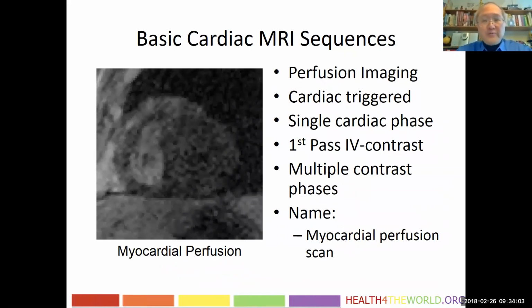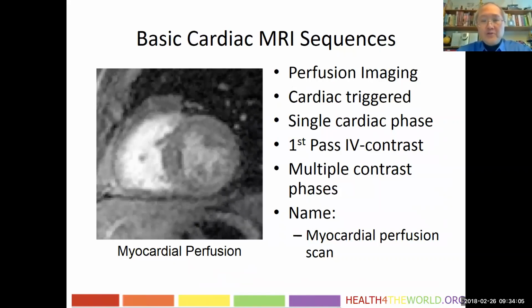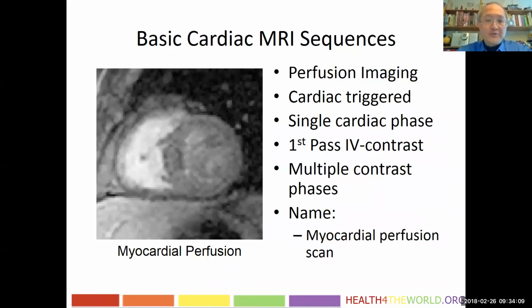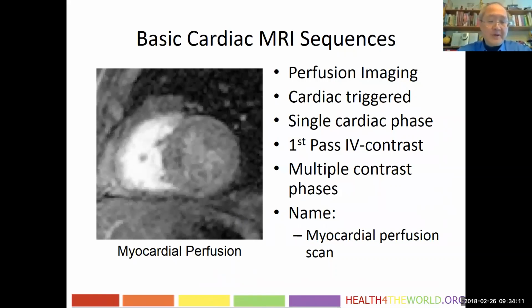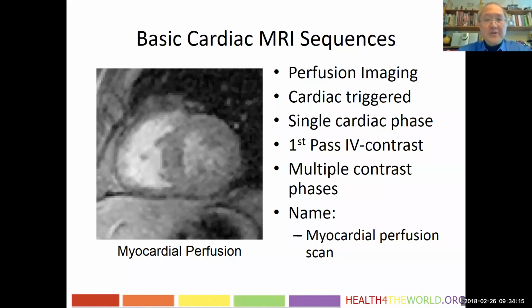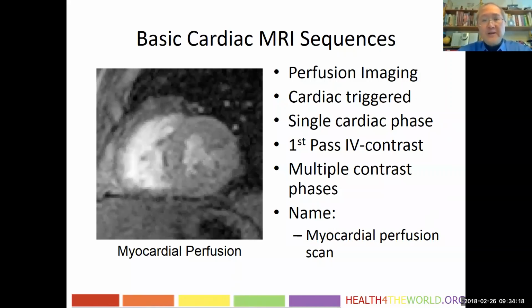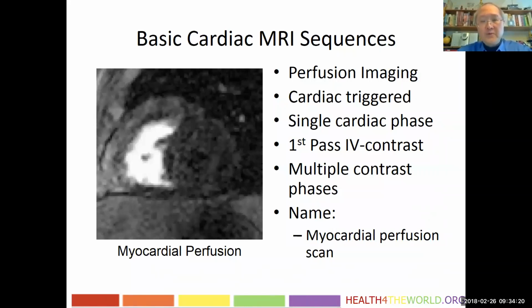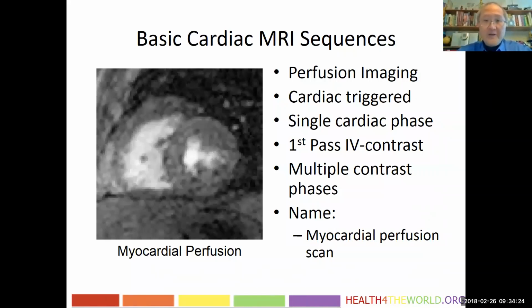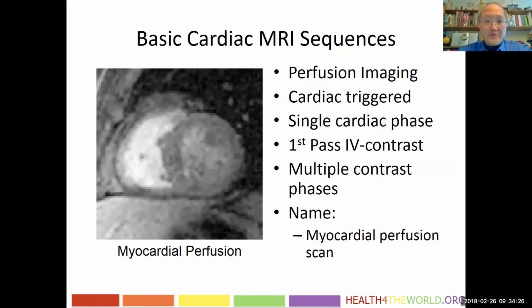Now, perfusion imaging is sometimes quite important for lesions that have very hypervascular structures, such as angiosarcoma, hemangioma, and some of the neuroendocrine tumors. And in those cases, the enhancement can be so fast that it helps differentiate from some other more slowly perfusing masses. And so we do this by perfusion imaging.